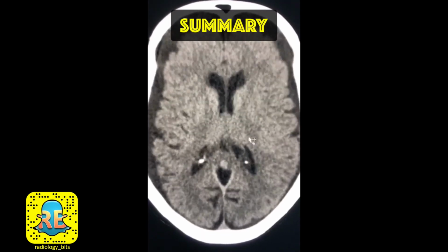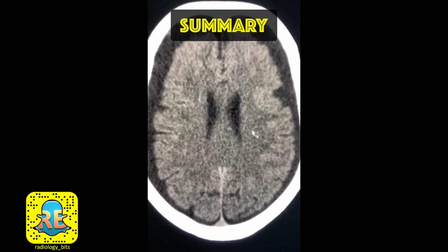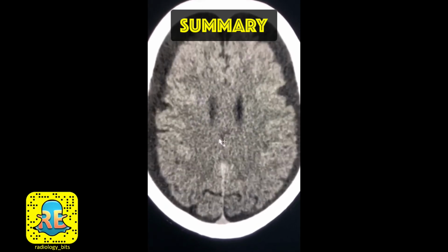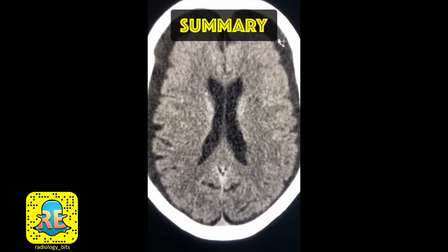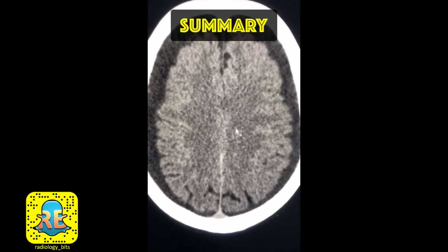So let's summarize the teaching points here. The first thing is volume loss is commonly encountered in older patients. However, make sure that that's the case and that you don't have compressive abnormalities from outside that mimic that phenomenon. The second teaching point is you could have unilateral or bilateral subdural hematomas, which could be acute and bright or chronic and very dark, simulating CSF. If you have a bilateral chronic subdural hematoma that is symmetric, that could be easily missed.